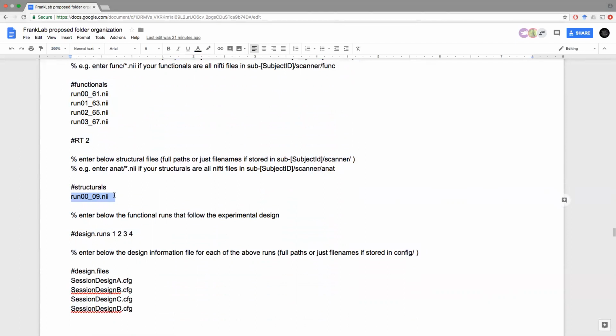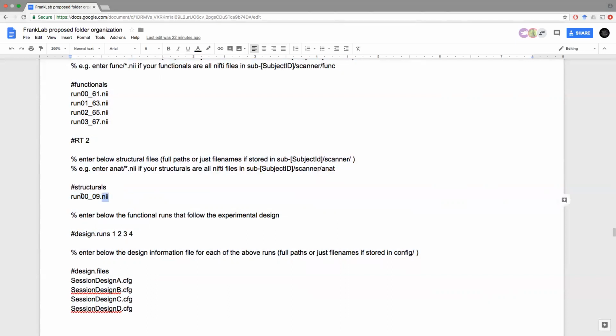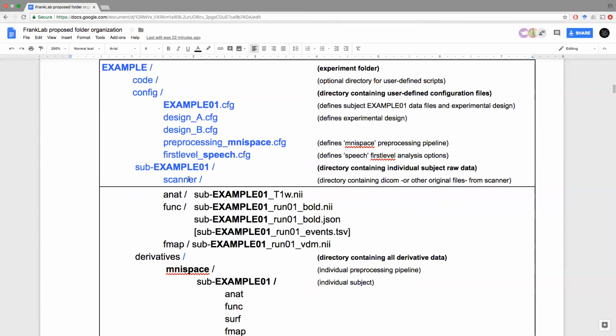Is it best to keep the FreeSurfer pipeline in a different folder that we're going to have basically for every subject, and then in here point to that? Is it best to keep it inside these original subject files that we are entering here, or will it be best to copy them to the scanner folder? Another option would be to just copy that in this folder. So when you have the scanner folder, enter there also the results of FreeSurfer and have that as the raw data that you use for that particular subject.